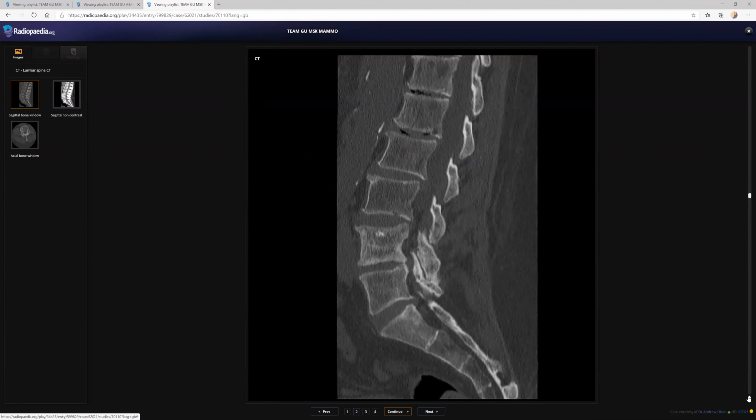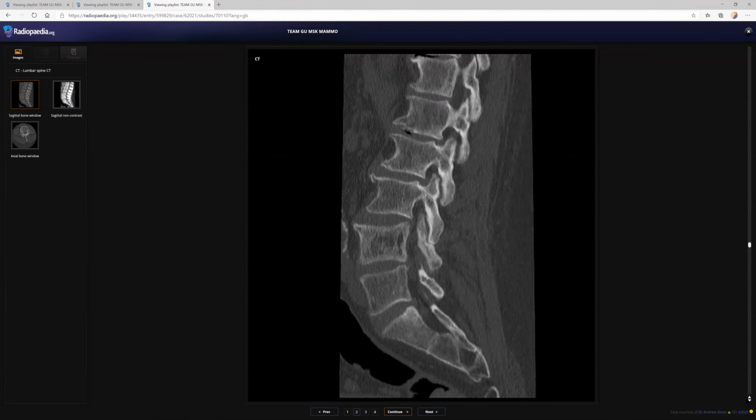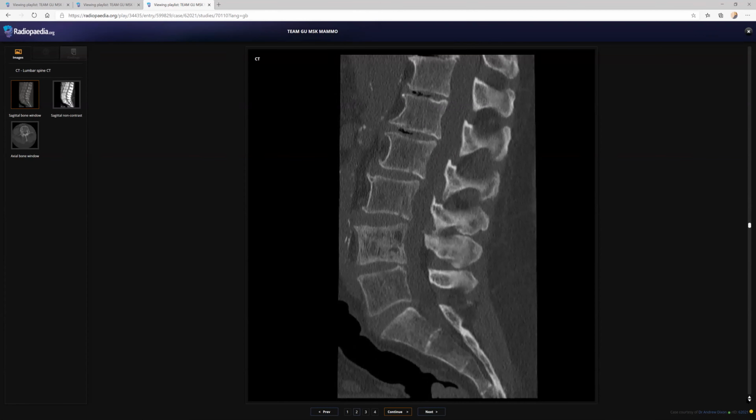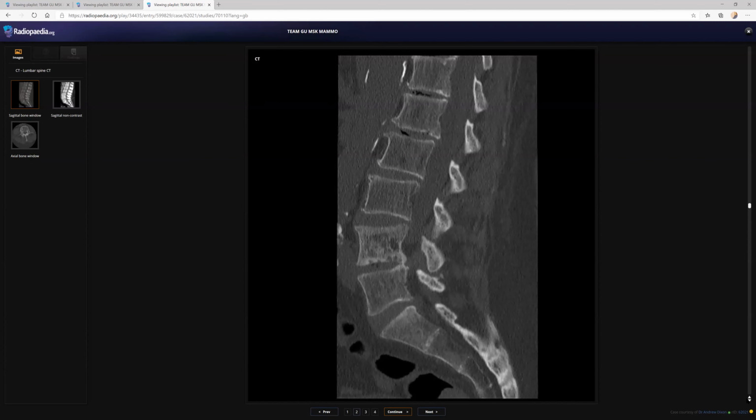Forget about the degenerative changes in the disc. There is heterogeneous texture and density of the posterior element as well, of L4 vertebral body, of L4 vertebra. So this is a heterogeneous vertebral body with no collapse, and it is maintaining the normal shape and contour with no paravertebral or prevertebral collection, apart from aortic calcification.